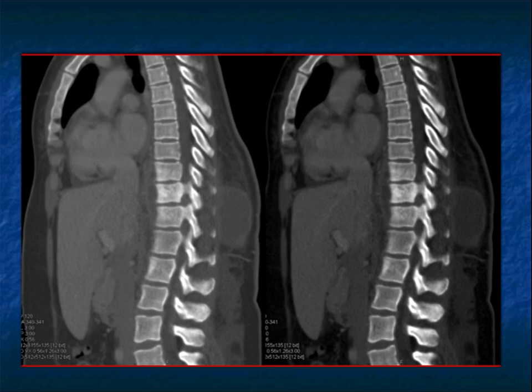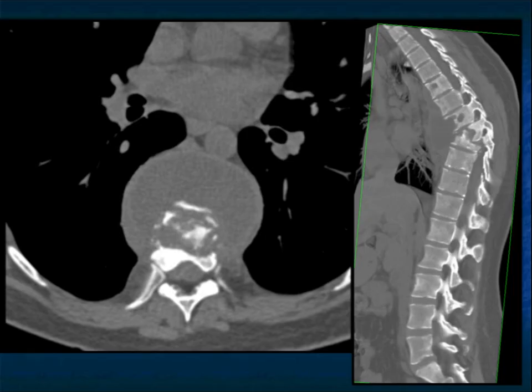And here's a few more images. Just a beautiful example of TB. And again, TB typically leads to discitis. This is what I would call a mild case, perhaps, though there is a large soft tissue component and a large abscess present. So perhaps it's mild relative to the bony changes.